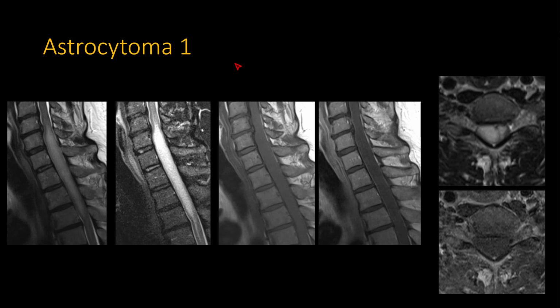Now here's a case of an astrocytoma, and this is probably much more tricky to sort out whether it's a tumor versus something inflammatory, because here there's just pretty homogeneous hyperintensity throughout the cord, and it doesn't really enhance. All of it sort of looks the same. It's not like one part looks like a mass and the rest of it is not mass-like. However, one thing is that it's really got this shouldered appearance. It expands the cord greatly, but the upper margin of it, where it expands, really abruptly ends, and that would be pretty rare for your inflammatory processes.